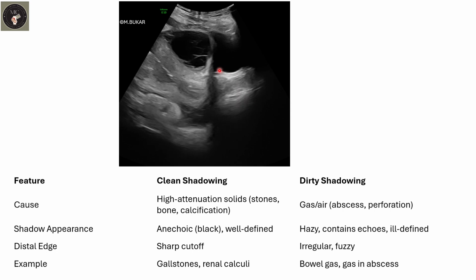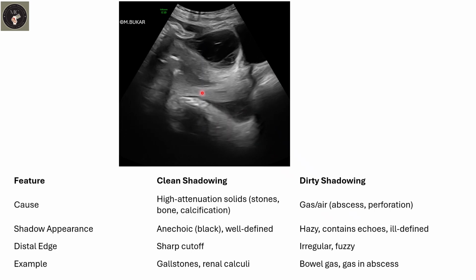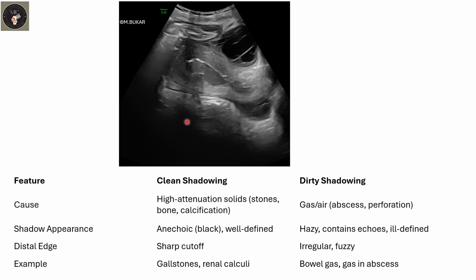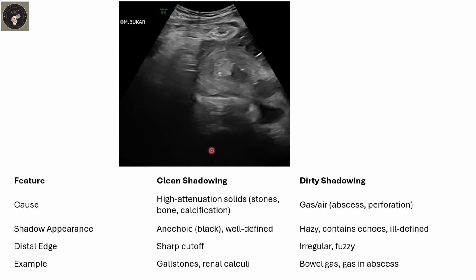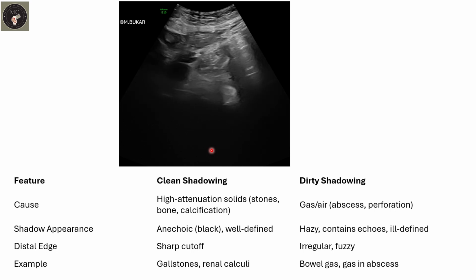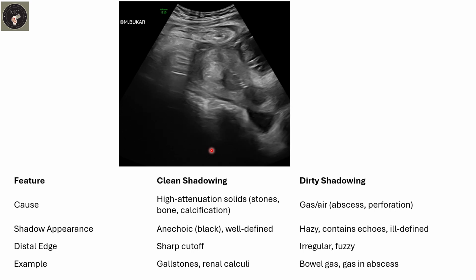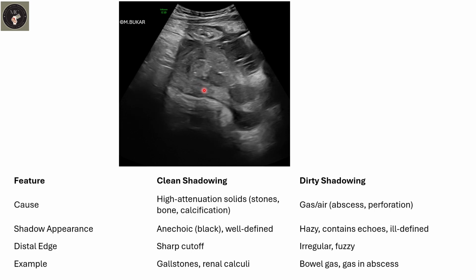We come back to this later. So you see this clean shadowing here, and look at the characteristics of clean shadowing. So clean shadowing from fetal parts here.